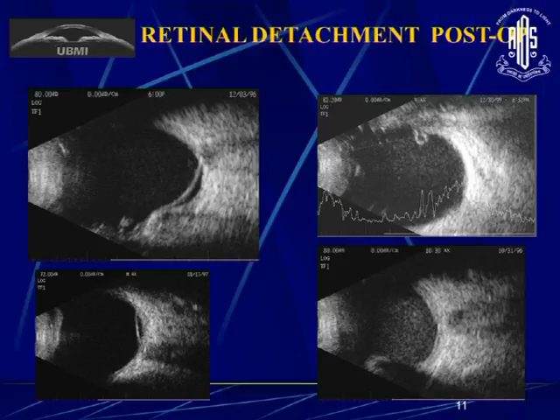When we are dealing with post-operative retinal detachments, this is a scleral buckle. You see a detachment from the optic disc to a buckle. That's a classical vitreous skirt, which is seen always after a vitrectomy patient. It should not be confused for a retinal detachment. And you get a small, sometimes elevated retina at the periphery or at the posterior pole in a post-operative status. And this elevated retina because of serous fluid collection should not be confused with detachment. You need to follow this up. A lot of times this settles down on its own.